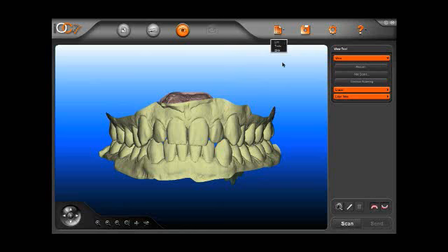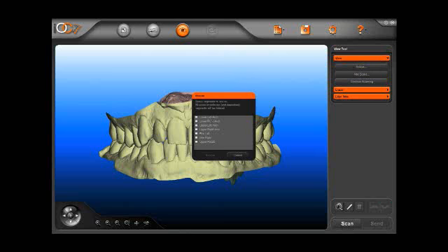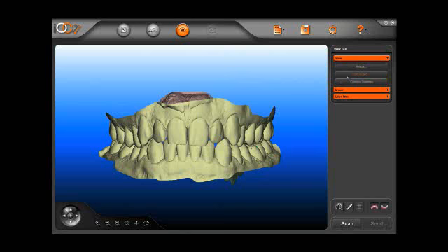Menu button, Save button, Settings, where scanning and user preferences are stored, Help menu. In the View tool, there is an option to rescan specific areas as needed. There is an option to add scans or continue scanning beginning from the last segment.